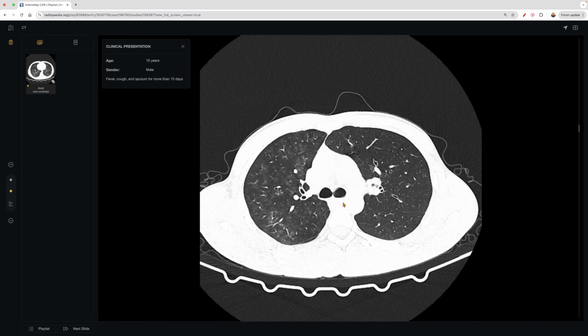We won't talk too extensively about it, but you can see that all those opacities are coming into play, right? All that haziness, ground glass opacification is what we call it, and we'll discuss more about that in another video. Let's reload.